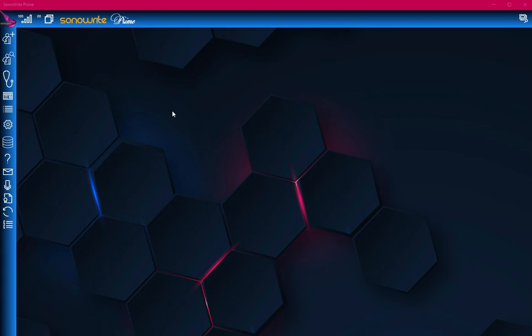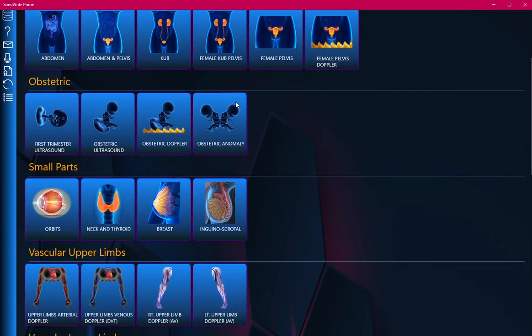Hi fellows, in this video I will tell you how to write renal vascular Doppler ultrasound report.